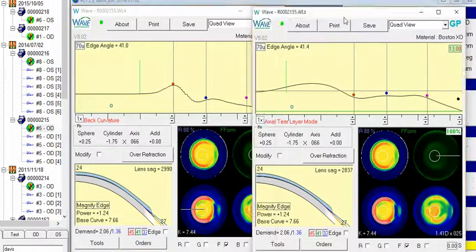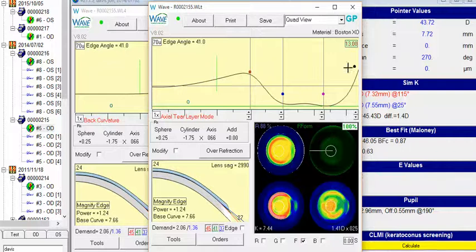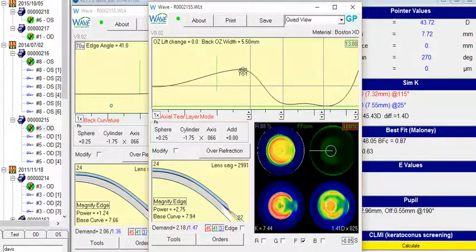I wanted to smooth that out a little bit so you hopefully don't get as many rings on that cornea and the topography. And so basically I left the same size. I added a little aspheric component into the design right here using the 0.5. I changed these back OZ to about 5.5 and maybe 7 or so. Get that in here.